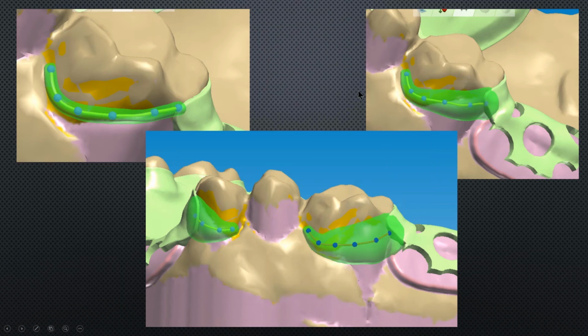And anyone who's used to working with the Zerlux acetal, the difference between that and the VisiClear is what you see here, where we need broadness. This material has a little bit more flex to it. In order to have proper retention and really aesthetics, I'd like the clasp to be much wider and flatter to the tooth. That makes it more aesthetic because the light can pass through much easier because it's thinner. Also, food won't get caught on it because it's going to be flat to the tooth. It won't rub the cheek, like a big old fat clasp would.